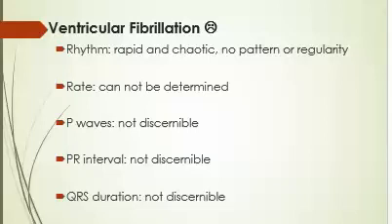Now that scares me. There's no QRS because we know that QRS represents what? You're absolutely right. Ventricular contraction. So if there's no ventricular contraction, then there's no what? You said it. Yeah, come on, get your confidence up. There is no cardiac output. We need to have QRS. They are important. So at this time, this is a life-threatening dysrhythmia.